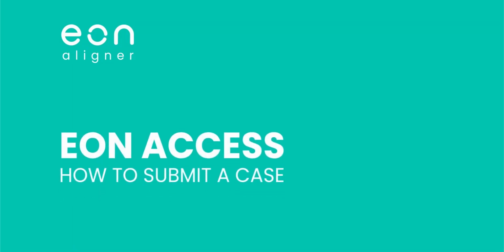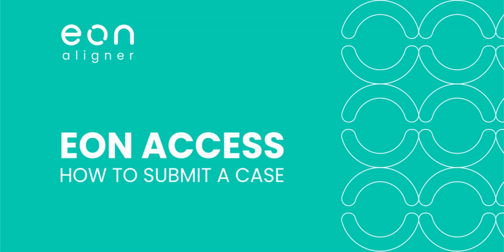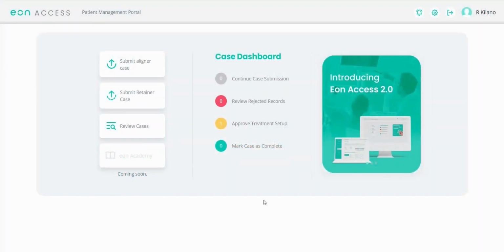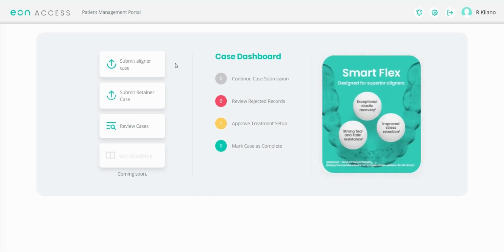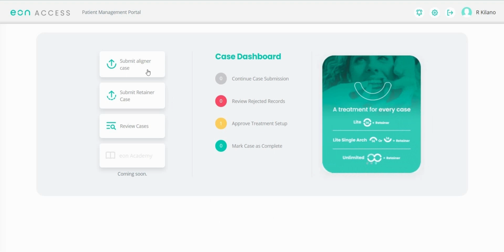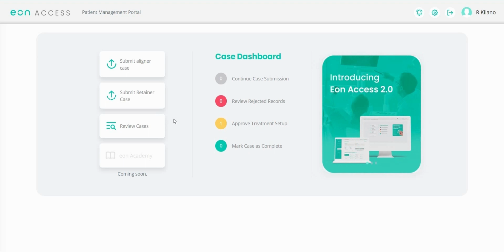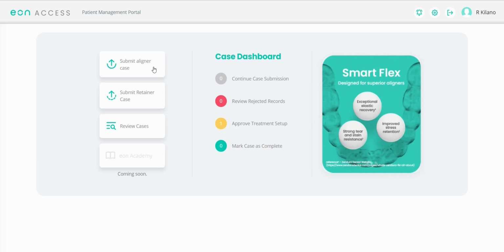In this video, we will show you how to submit your Eon Aligner case. Once you log into your account, this is the first page you will face. As you can see, there are 3 options that you can choose from: Submit Aligner Case, Submit Retainer Case, and Review Cases. In this video, we will be focusing on how to submit an aligner case. So, we'll go ahead and select Submit Aligner Case.